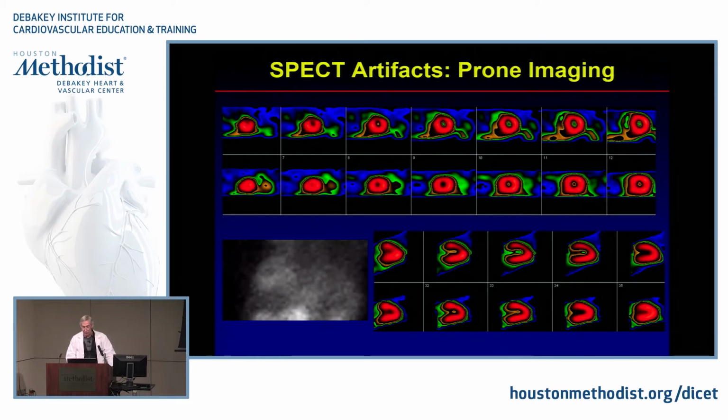Let me show you another example. This is a patient who you can see here has an anterior defect.